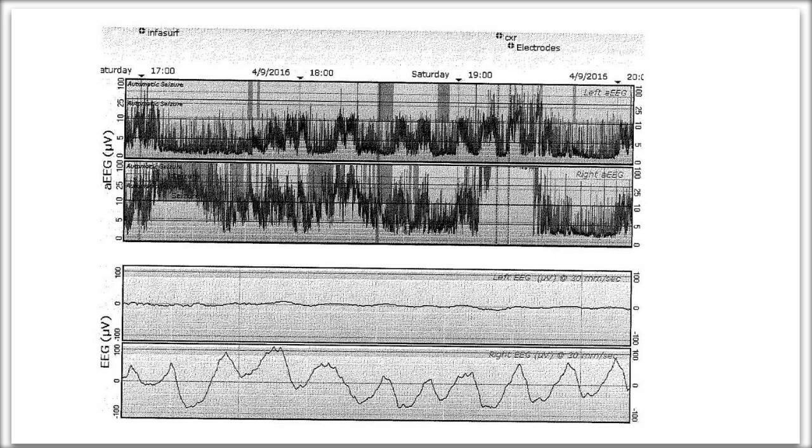We also know the baby was on high frequency, but it doesn't seem to be really affecting the band that much. We do see a couple areas along on the right EEG where there's a little bit of jaggedness on a couple of these waveforms, which would make you think that there is probably some breakthrough.